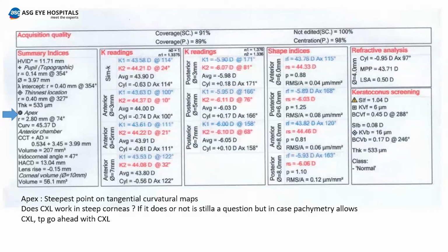True. And another thing, supposing there is a patient you want to take for refractive surgery, and the Sirius is showing an abnormal cornea. Would you repeat a Pentacam, and do you see any difference in that? I have definitely found Pentacam repeatability as well as reliability to be much, much better. Many times in abnormal corneas, the Sirius just ends up giving us something like data unclassified or abnormal, or the class finally does not leave you with a comment in the end.